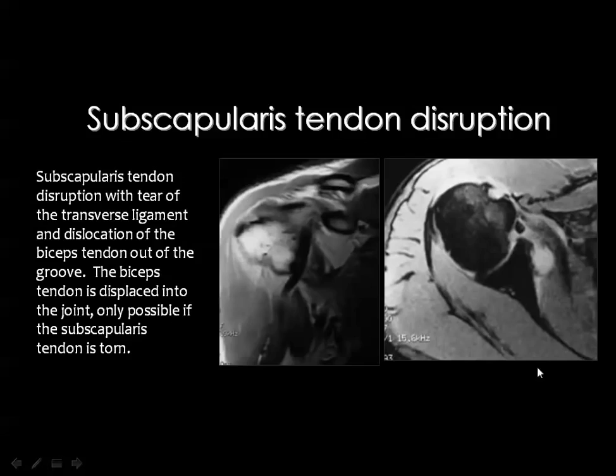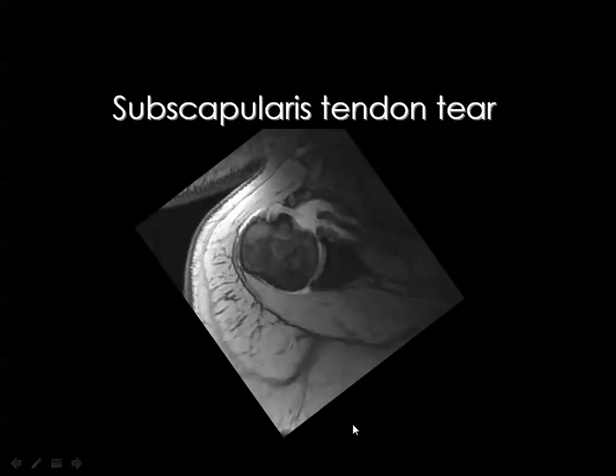And this is also another example, and I recommend to evaluate biceps tendon abnormalities in the axial image, looking at the tendon within the groove. It's relatively difficult to evaluate the dislocation or subluxation of the tendon in the coronal images. And this is the subscapularis tendon, and this is the biceps tendon, of course, which should be here. It has been dislocated outside the groove.